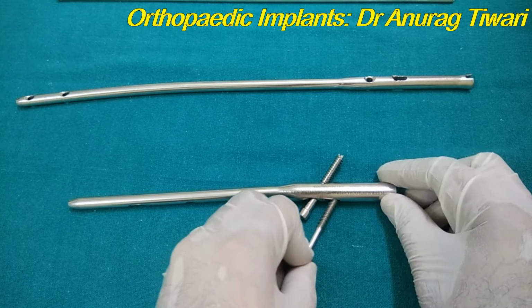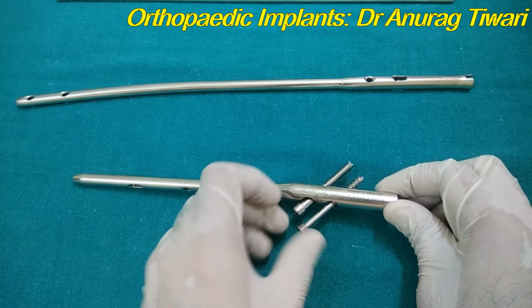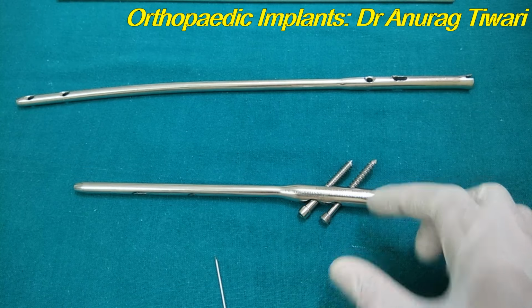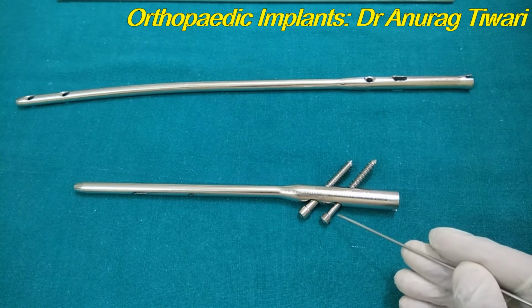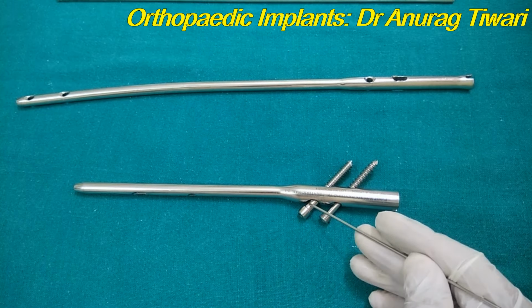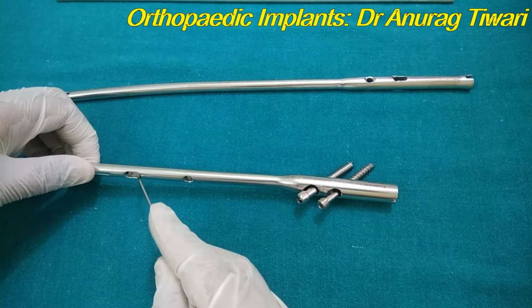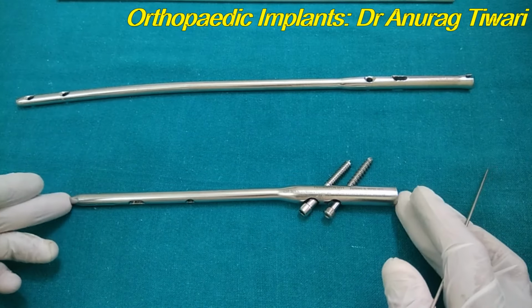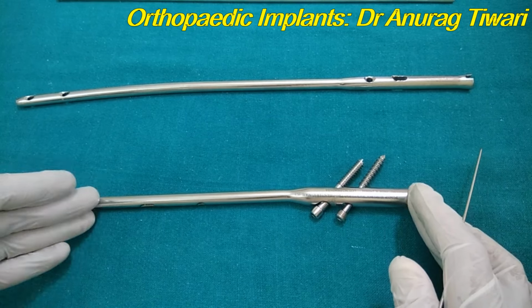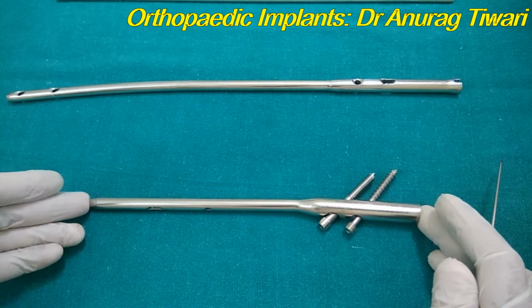This is not actually the screw of this nail, but I am just showing you. There will be two screws in the proximal fragment. This is the medial side, this is the lateral side, and this one is 6 mm and this one is 8 mm in diameter, and again there will be two holes for the interlocking in the distal fragment. So this is actually a short PFN. The length is small. The long one will be the same as the femoral nail. The size will be the same. But this is the proximal femoral nail.